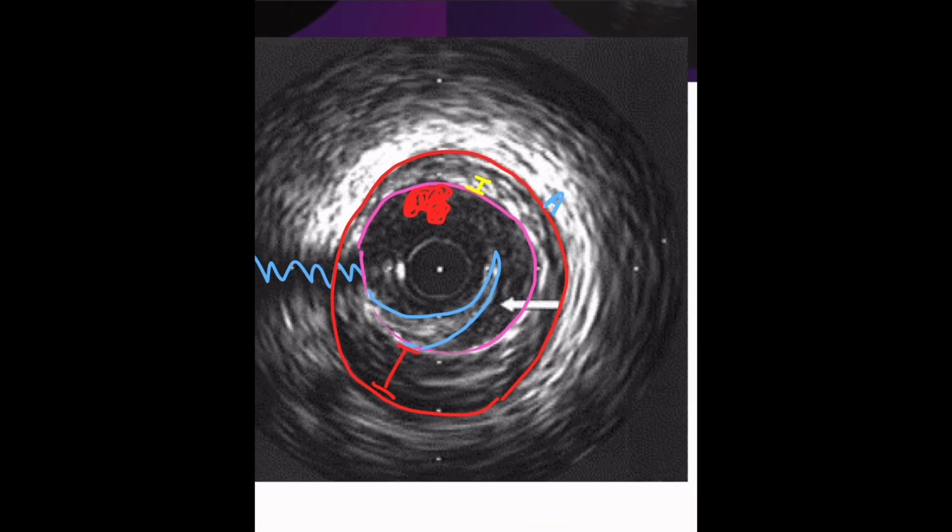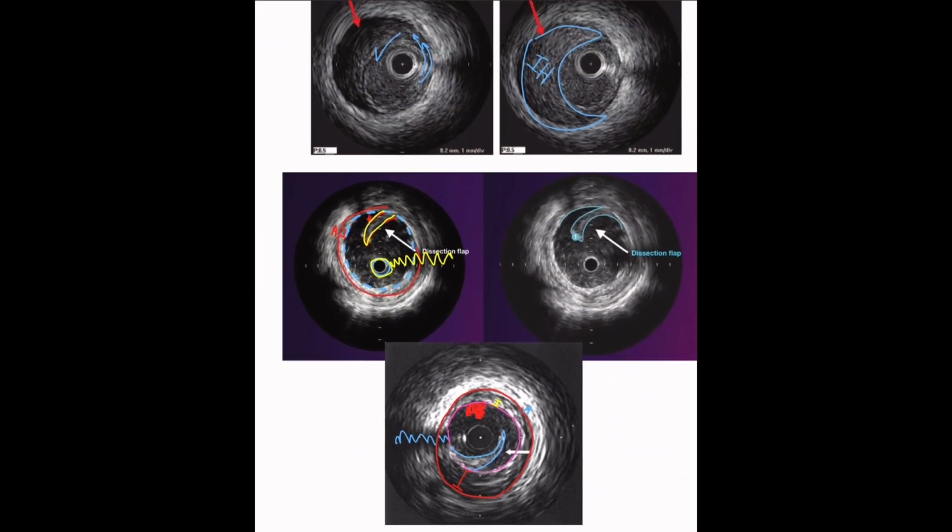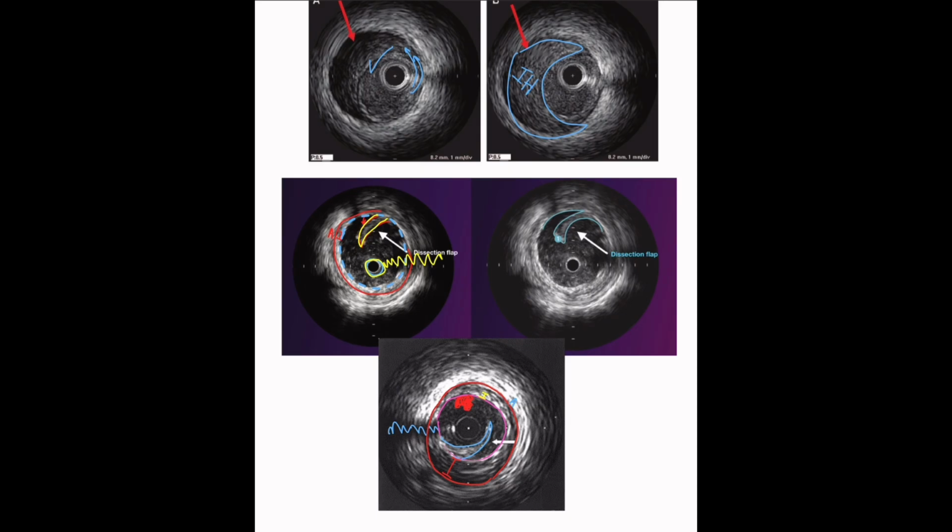So you are also looking at the smoothness of it to tell, is this tissue or is this clot? And then same thing here, you could have a hematoma develop in this space a little bit, or thrombus develop in this space. Same kind of idea, just one's more organized than the other.